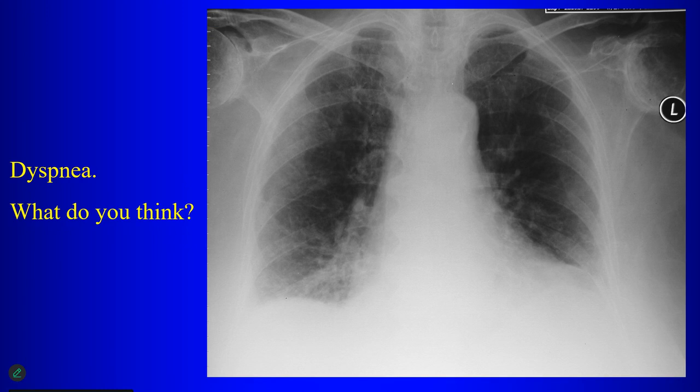Now we can go through the whole thing. UIP. Oh, okay. What is it? That left shoulder looks pretty abnormal. How about the right shoulder? I can't really see, oh, no, I can see. It's also previous stuff, so maybe rheumatoid. This is rheumatoid arthritis. Yeah.